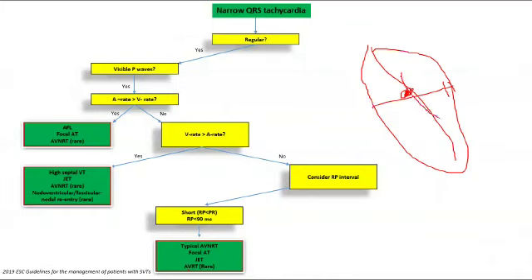For a narrow complex tachycardia, you have antegrade conduction down the AV node and retrograde conduction up the accessory pathway and activates the atria retrogradely. So down the AV node, you get a QRS complex, up the accessory pathway retrogradely to activate the atria again, and you have a retrograde P wave over there and your T wave. So you get a bit of a longer RP time compared to what you would see with typical AVNRT.